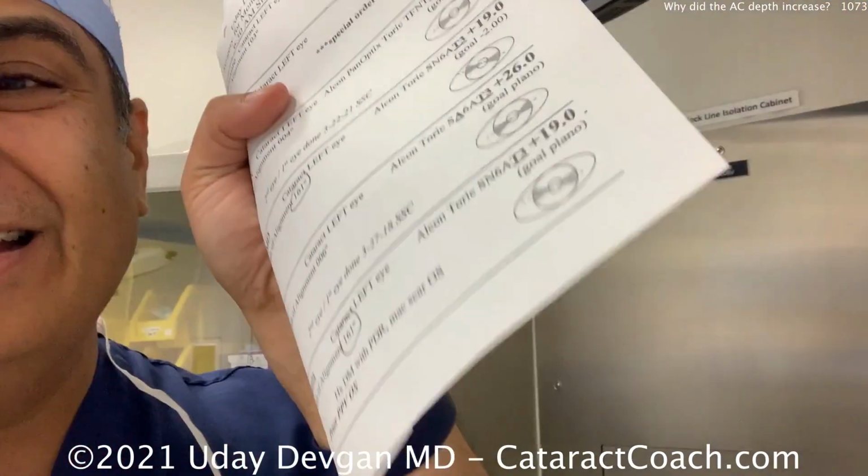So it's so important that this sheet that you see of mine, I made this. I typed it up. I confirmed the numbers. And today when I noticed that, wow, 2 people have the identical lens and the same axis, and a third patient has another toric lens with the same axis, are they all really 161 degrees? The answer was yes today, but I wouldn't have known that if I didn't double check it and make the list myself. So avoid these errors by being your own boss and taking responsibility, because ultimately you are the captain of your own ship and you need to make a sheet like that.